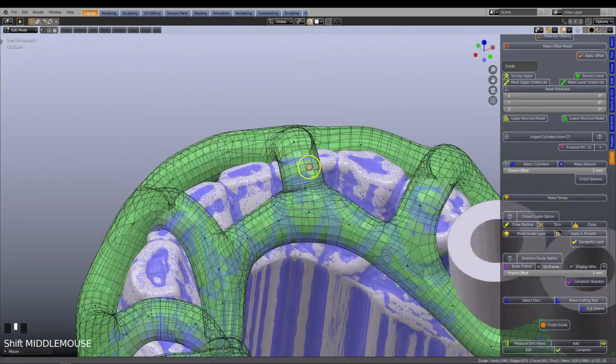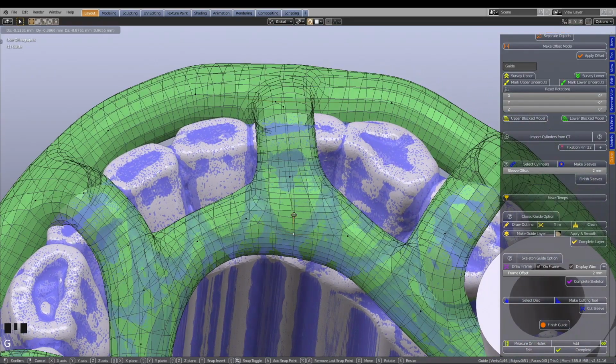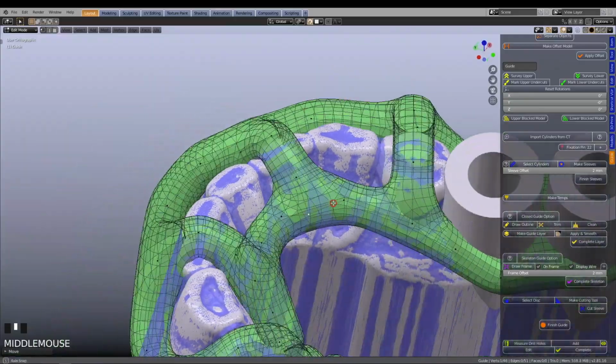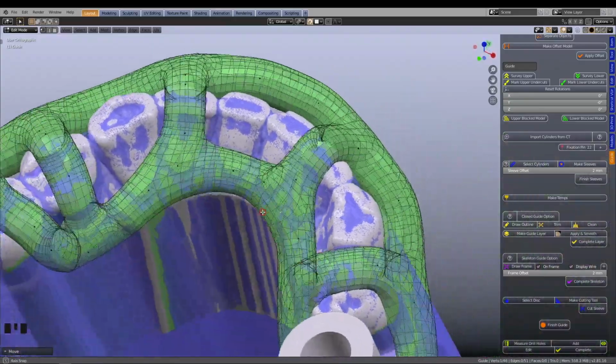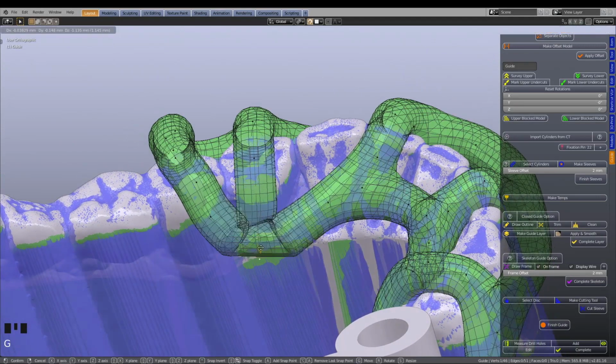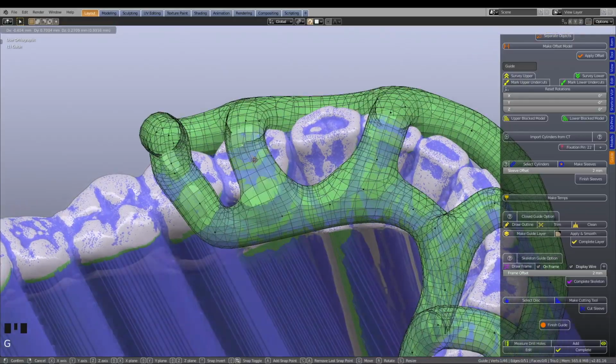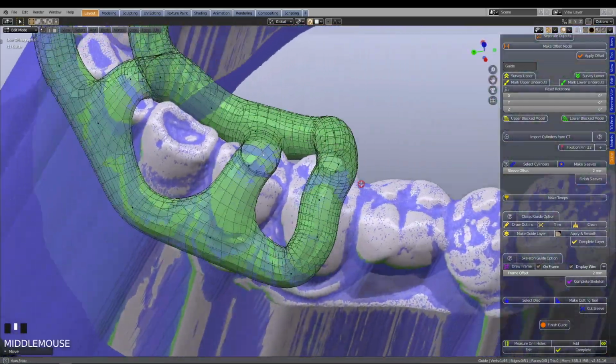We will need to repeat this process on all the other adjoining areas. Please remember, a clean and organized mesh structure is easier to slice and to print. Use G, and move the mesh until it becomes relaxed. Something like this. Inspect the frame.